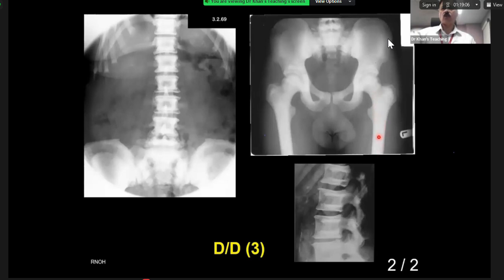In the diaphysis, not visible in this particular case, you can get lucencies along the longitudinal axis. But at the iliac wings, you will get this arcuate type of lucencies or bone within bone appearance. This is considered quite specific for osteopetrosis.